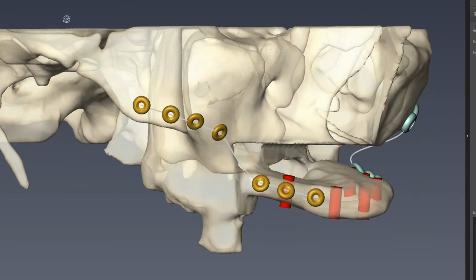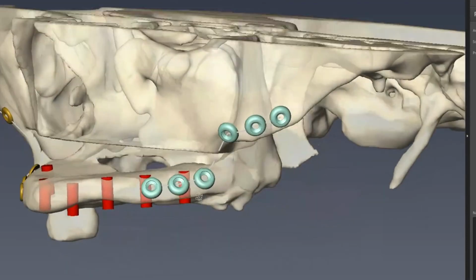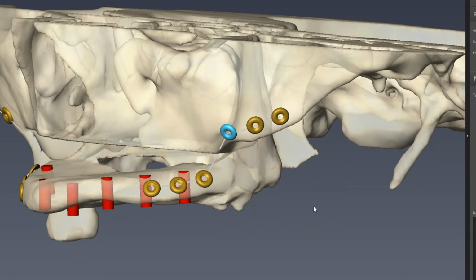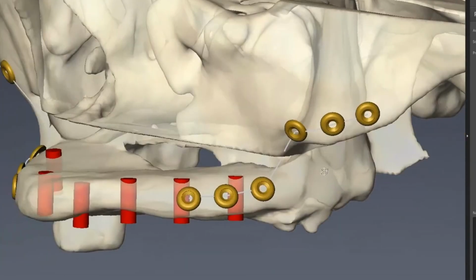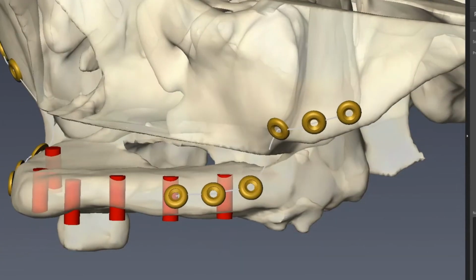And let's see the other side as well. It looks like I'm kind of coming right into the implant there, so I can move these holes forward to avoid that implant. Fine. And then I will get this dropped down to the 1.7. Would you be okay if this one came anterior and then I can just move that one in between? Fine. That's fine. Okay.